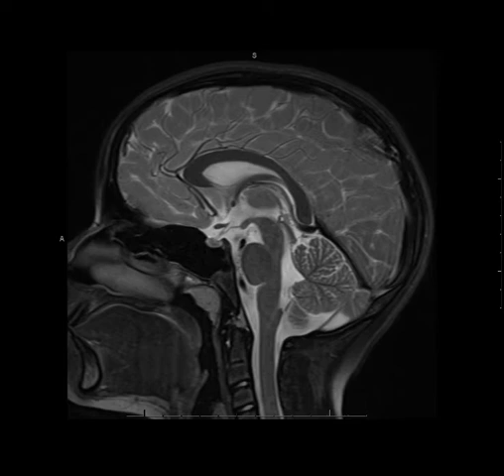Alright, let's go back to the third ventricle, and if you use your imagination, you can think of the anterior aspect of the third ventricle as a W that you'll see here outlined in green. The structures that make up the W, starting from the upper left, are the anterior commissure, which is a white matter tract that connects the two temporal lobes together and is involved in olfaction.